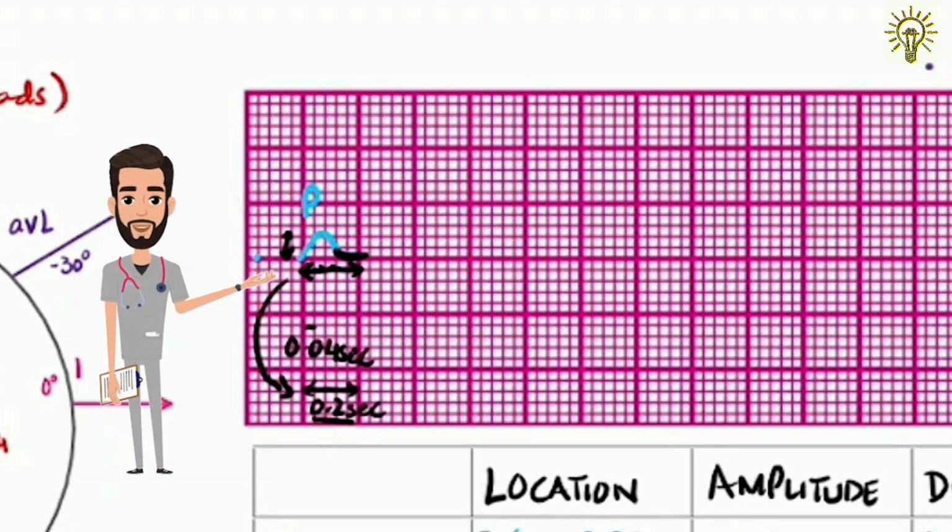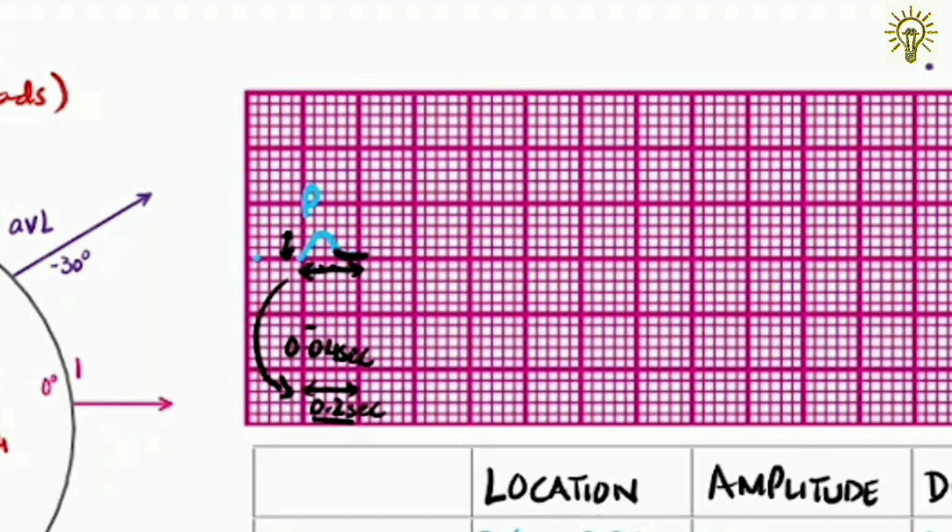We will gradually come to discussing the pathological side of each segment in future episodes. Like, a prolonged PR interval may signify AV blocks and a shortened PR interval may point towards pre-excitation syndromes. This will be touched on in subsequent episodes.